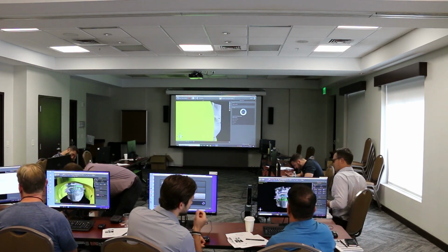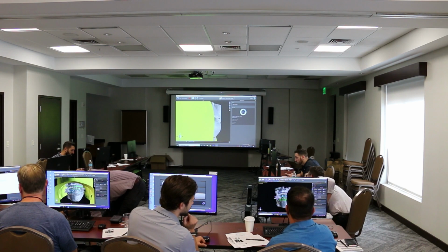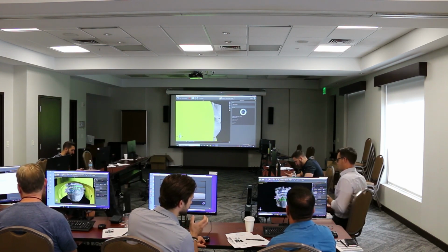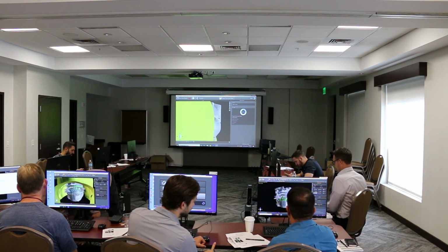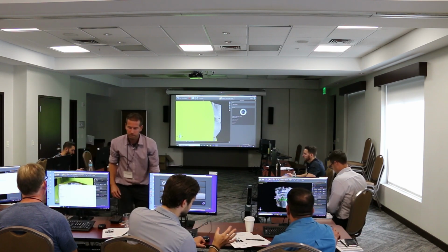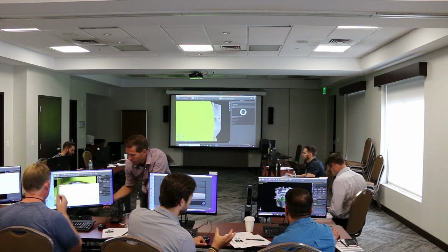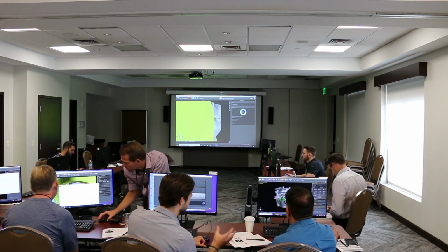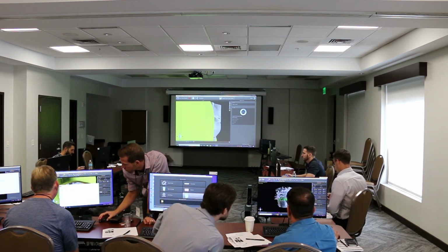I'm just gonna drop those, these are all the files. It looks at the CBCT that comes in and asks, hey, where does this belong? It's gonna stitch it to there. Get it to work. There we go, that's pretty good.